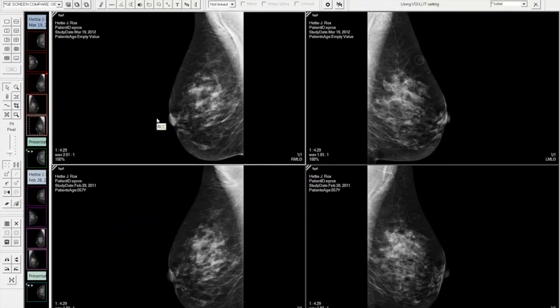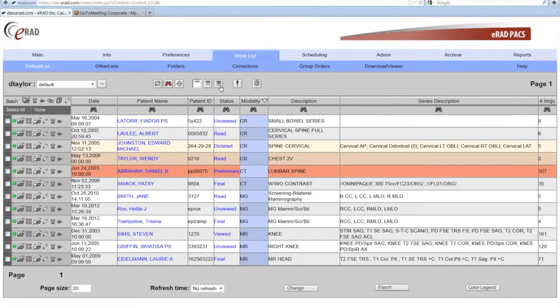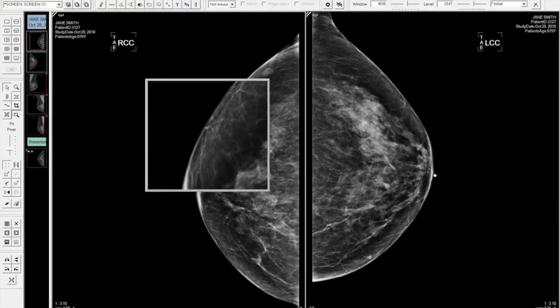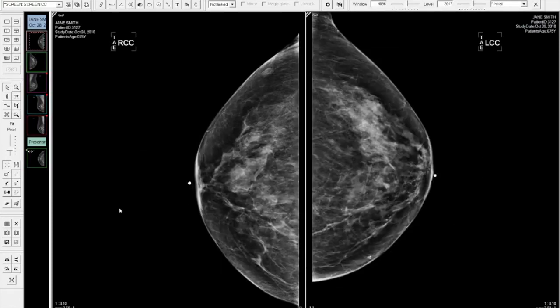This is a GE mammogram, which comes to me in a different format, and I can display it differently than I would the mammogram that came to me from another vendor. So I can create all these things, I can combine them, I can use macros to move among them, I can use macros to open my tools. So I can do all those things. They can all be included in my hanging protocols.